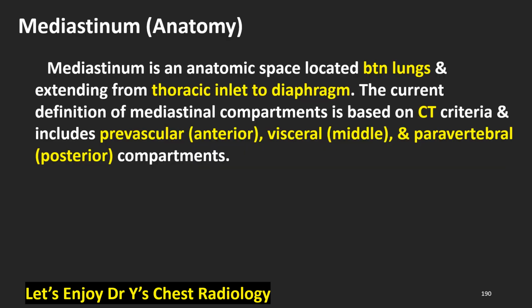Mediastinum anatomy. Mediastinum is an anatomic space located between lungs and extending from thoracic inlet to diaphragm. The current definition of mediastinal compartments is based on CT criteria and includes prevascular anterior, visceral middle, and paravertebral posterior compartments.